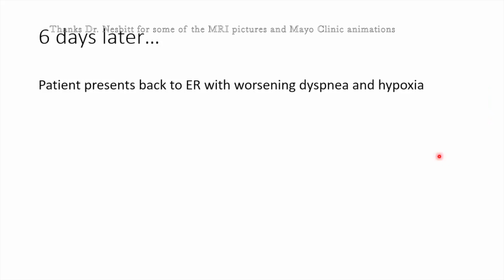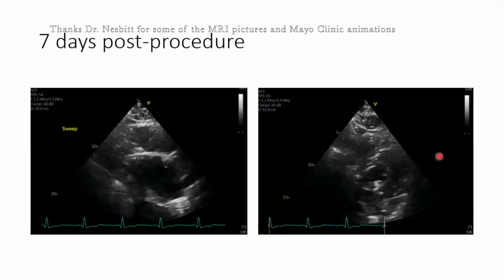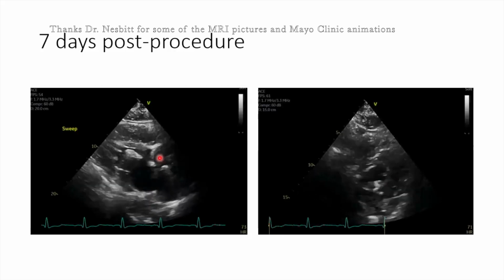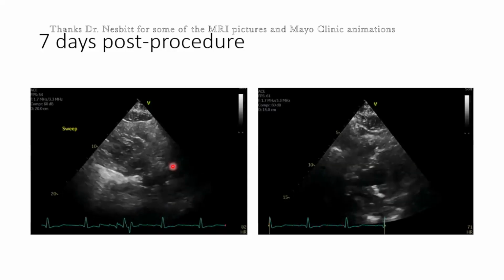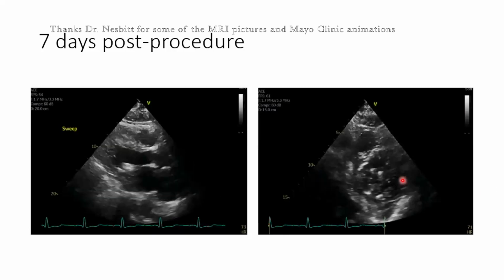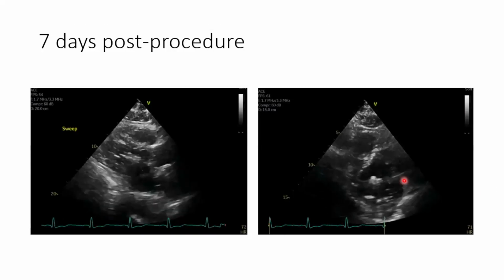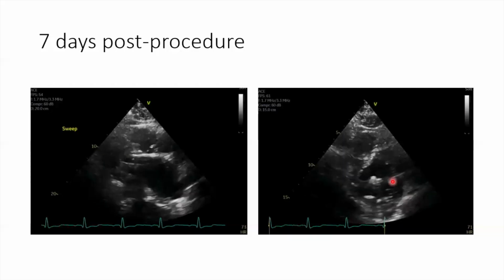The patient actually felt better, but then 6 days later, after being repatriated back to the sending hospital, he developed worsening dyspnea and was suddenly hypoxic on 5 liters of oxygen. And so when we repeated the echocardiogram, I felt it was difficult to appreciate all this, but you can see they're still very mobile. And perhaps the lateral clip has slightly more independent mobility. I know the clips don't play as smoothly as I would like them to.